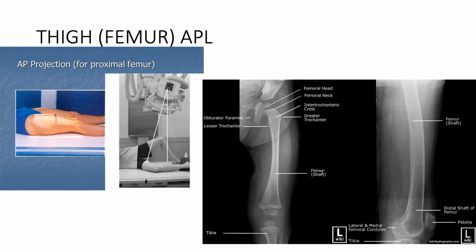So going to the femur, just like in the study of long bones, we request for an AP and lateral view because we want to see a more or less two-dimensional representation of the long limb. So you have to request an AP and a lateral view.